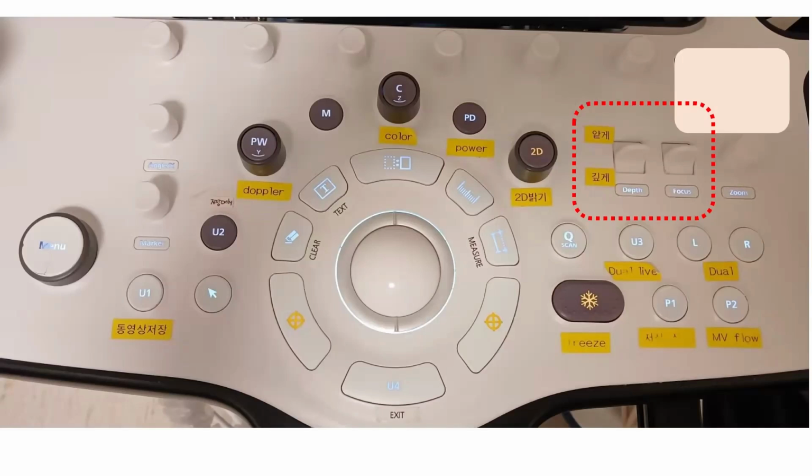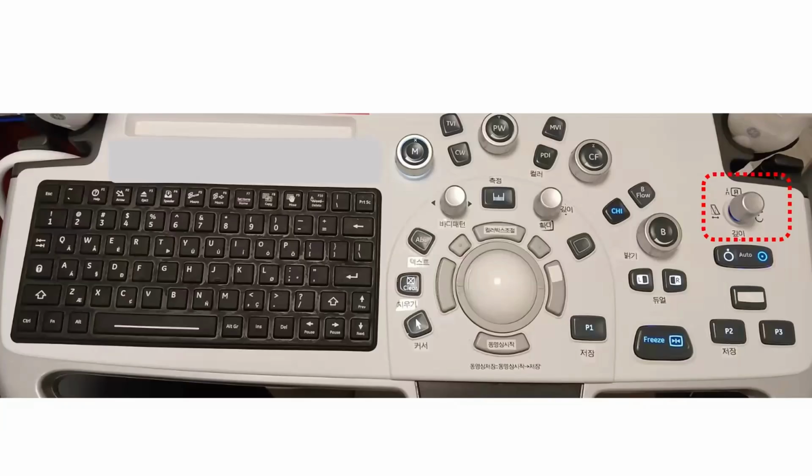Next, I will talk about focus and depth control. In my hospital, not only the doctor who uses the ultrasound device but also the assistant who helps the procedure knows the function keys. To make it easier to recognize, it is marked on the device like this picture. This device controls the focus and depth by adjusting the buttons up and down here. This ultrasonic device has a depth adjustment controller here. This device has an automatic screen adjustment, so there is no focus button.